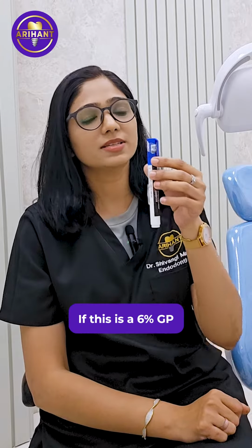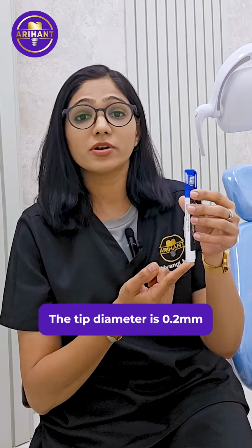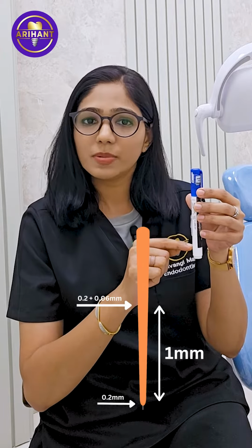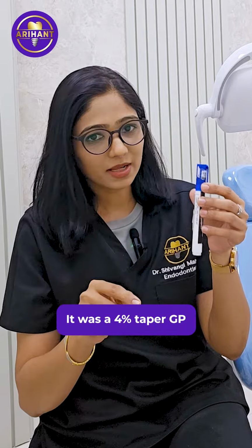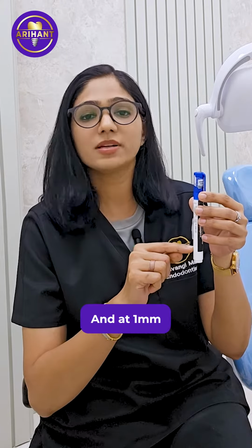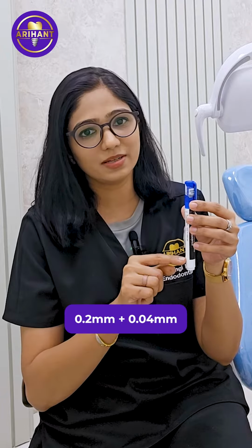For example, if this is a 6% GP, number 20 GP, the tip diameter is 0.2 millimeters. And at 1 millimeter from the tip, the diameter will be 0.2 millimeters plus 0.06 millimeters. Suppose it was a 4% taper GP, then the tip diameter is 0.2 millimeters, and at 1 millimeter from here, the diameter will be 0.2 millimeters plus 0.04 millimeters.